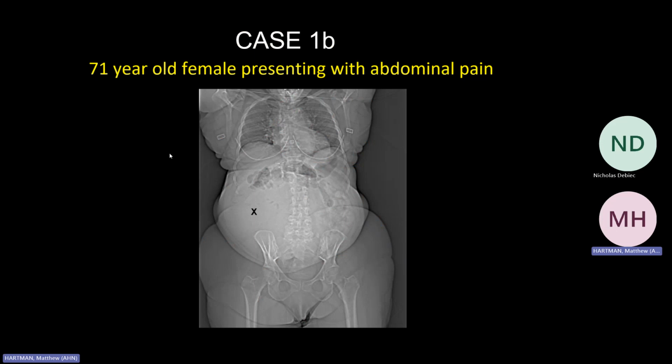Okay, another patient, a little bit older, 71-year-old, abdominal pain. My mnemonic for reading abdominal radiograph is stones, bones, mass, and gas. Mass is the hardest thing, in my experience, for med students, residents to pick up, but hopefully everyone can see if there's something here, right where the X is, and it's displacing the bowel, pushing it out of the way. We can imagine a big mass here. There's our bowel being displaced.